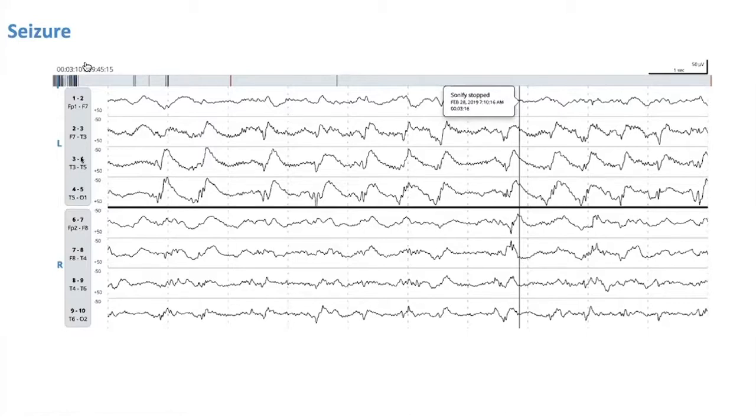So if it's happening around 3 and 4, certainly it's happening around 4, and therefore it should be affecting 4 and 5, and it should affect 3, which would affect the potential in 2 and 3. So that's why it has a field in the adjacent channels. That's right. Thank you for highlighting that, Dr. Stern.